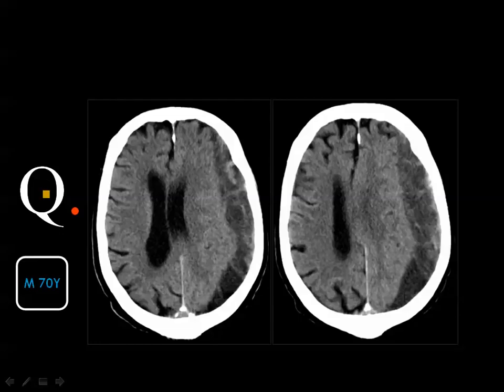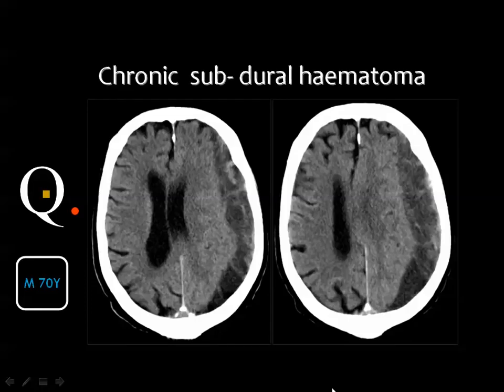Diagnostic of chronic or subacute or mixed subdural hematoma.